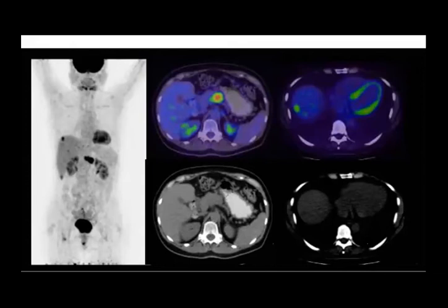Okay. So what do you think about here? This patient, 60 years female, again, has pain and elevated CA 19-9 marker. So you would suspect that there is a focal lesion in the liver. I see that, doc, multiple lesions in the liver with high uptake. So you think that maybe it could be metastasis, and you see the tumor inside the pancreas.